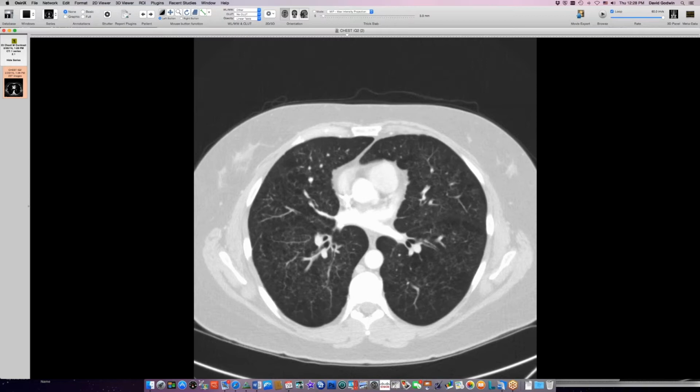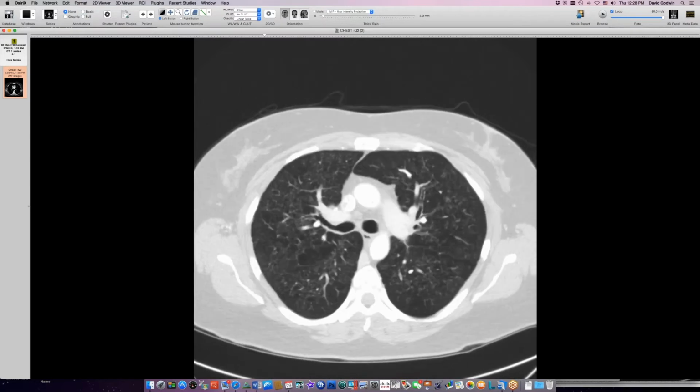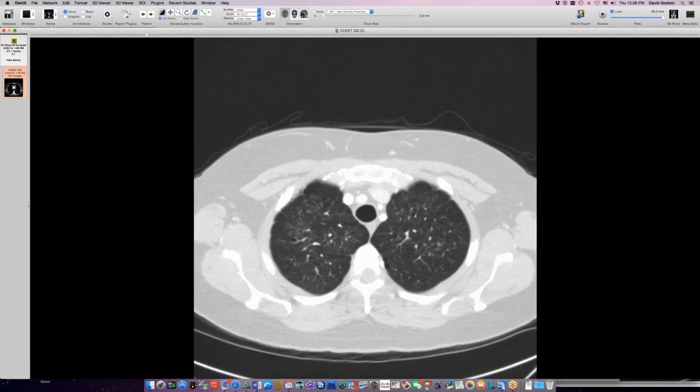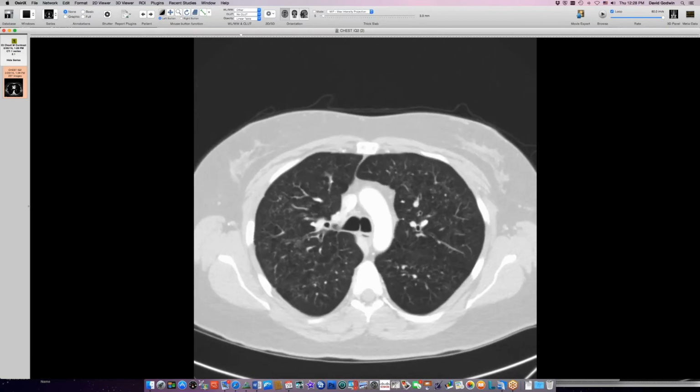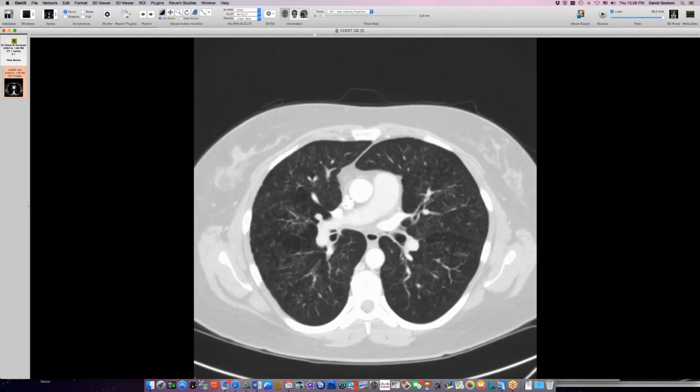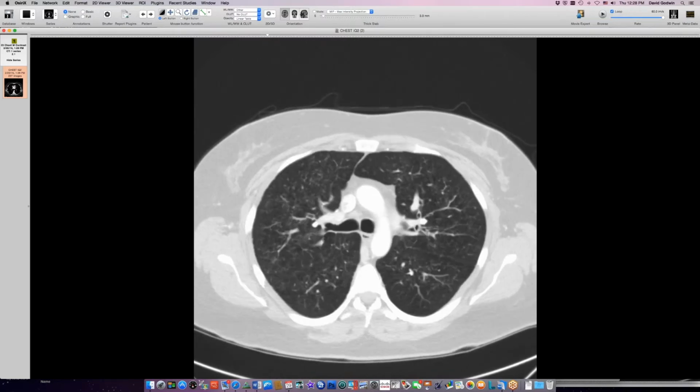Very interesting. David illustrates another point, I think we've talked about before, which is the relative preservation of the vasculature. When it's pure emphysema, you tend to get these little spidery vessels, but these are pretty decent, healthy looking pulmonary arteries and veins. And hers isn't as cystic as some of the really burned out, really advanced, end-stage ones that we sometimes see come for transplant billed as emphysema, but it's really mostly Langerhans.